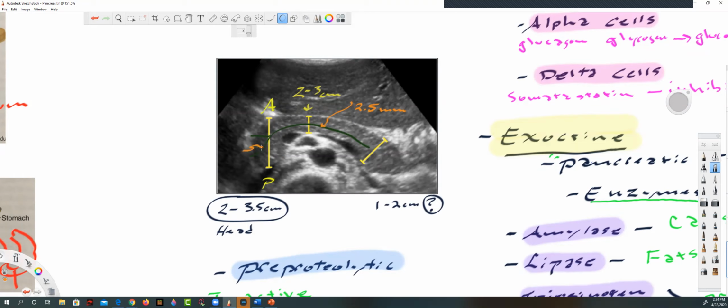And then it also gives a measurement here, and I actually never really considered this measurement, to be honest with you. But in the head of the pancreas, still the duct of Wirsung, not the accessory duct here, they say 3.5. Millimeters, right? And then it talks quickly about what it looks like.